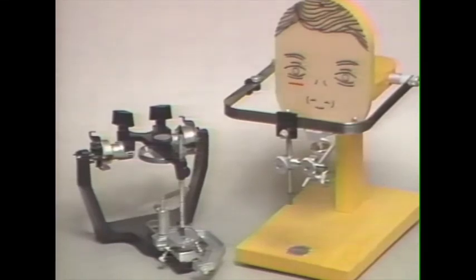We hope this videotape is an aid in understanding the advantages of using a facebow and a semi-adjustable articulator. The Hanau spring bow and modular articulator provide simple, easy-to-apply instrumentation for simulating jaw movement. Their wider application will result in prosthodontic restorations, which are better adapted to the individual patient's mandibular movements and fewer chairside adjustments.